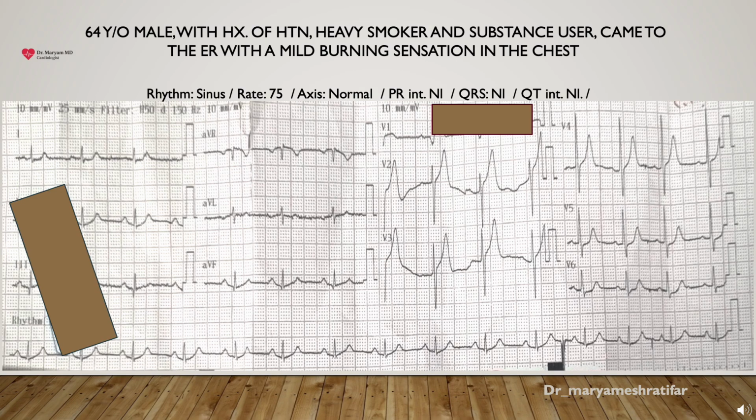For classic ECG interpretation, we first determine the rhythm. To confirm whether the rhythm is sinus or not, we need to answer 5 key questions. The first question is, does the ECG show P waves? As you can see, we have the P waves in all the leads.